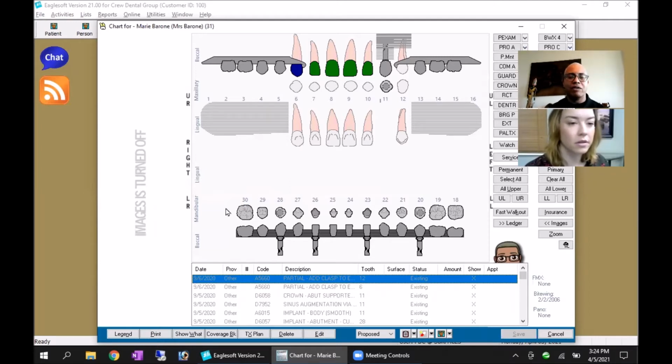Obviously this is an all ceramic setup, but I can see what's going on with this patient. And the natural teeth are so much more obvious because I'm not going to be doing any lingual restorations on these implant crowns. But I can definitely tell if I'm doing some restorations up here, because this person's got veneers to be done. So they have a partial upper, an implant at the upper, and an all-on-4 at the lower. The more you think these things through, the more you can figure out what's going to happen. The reason I got to this point was it really was all about layering, figuring out what needs to be done to layer the next step, and the next step, and the next step.